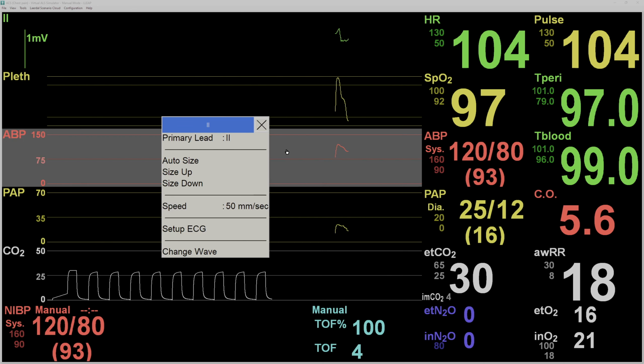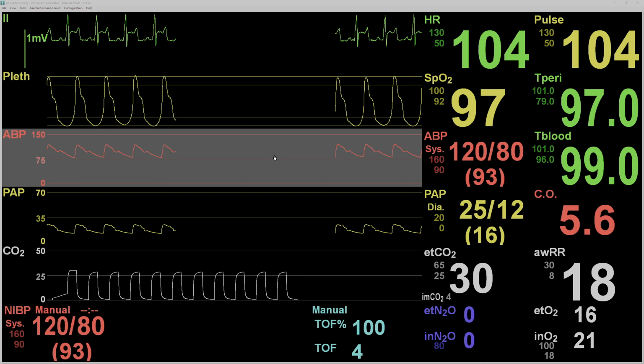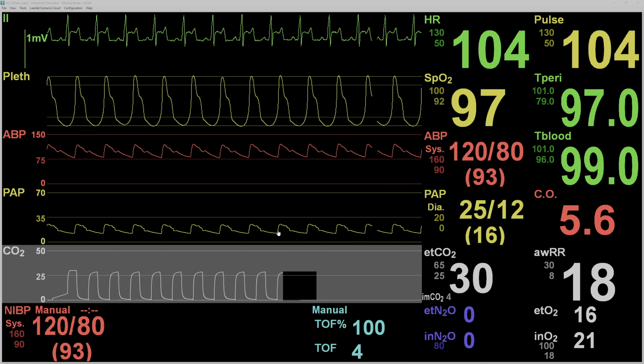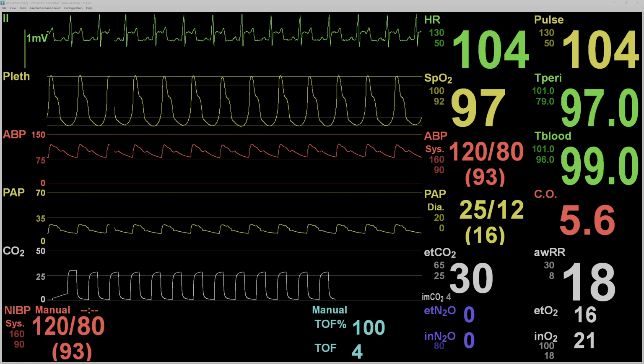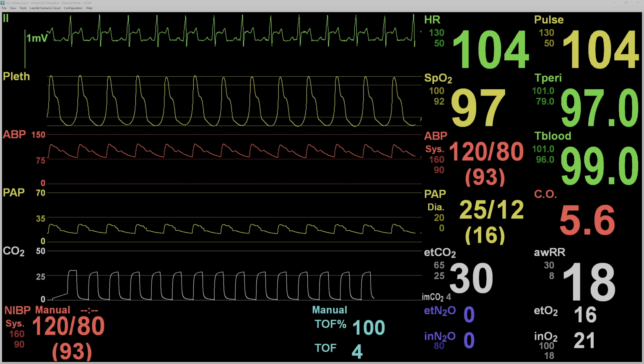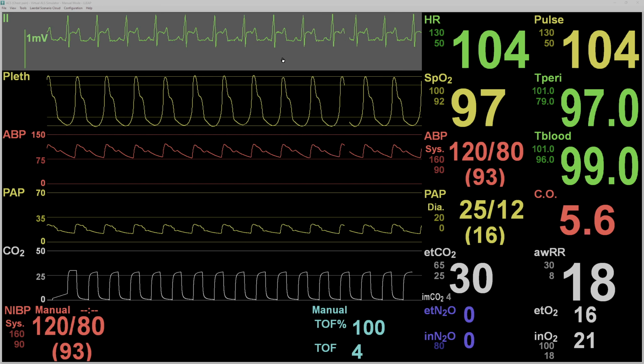I change it to 50 for it to be more realistic. There's also built-in desktop audio from the program that'll make a beeping noise if you set it to it.